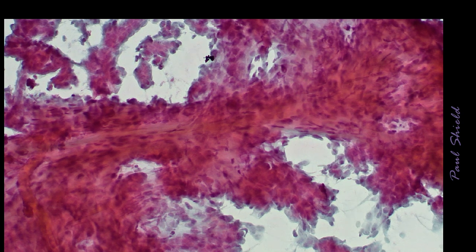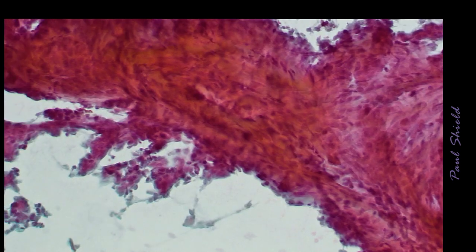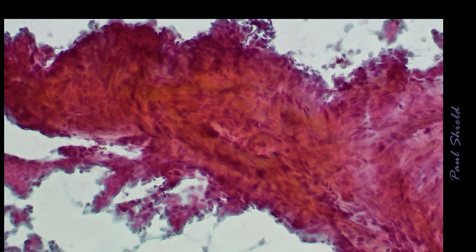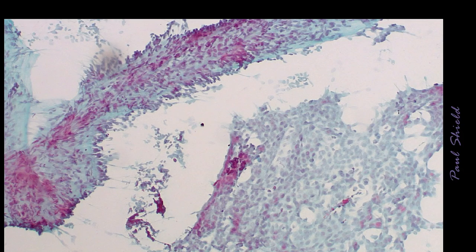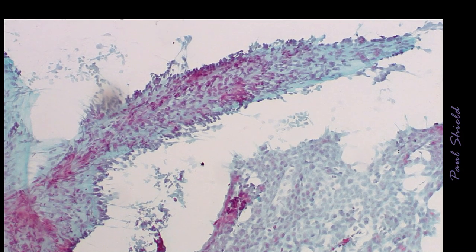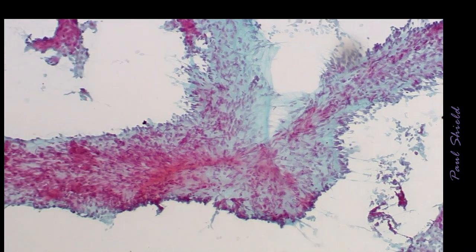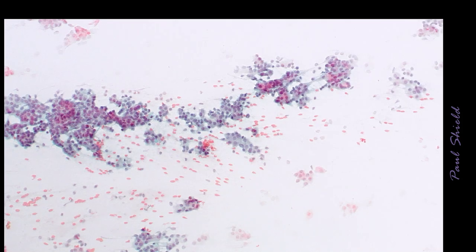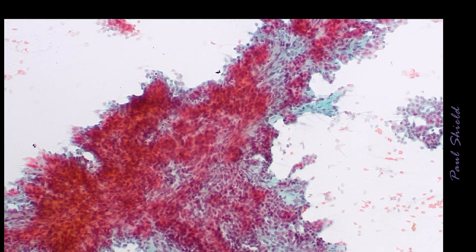And then in the background we have epithelial cells, and you'll often see them palisading in like a crowded palisade around the outside of the group. Often you can make out a bimodal pattern in those, but not always. Sometimes you'll get like this, which are like stripped cores, this collagenous vascular material that the epithelium has been stripped off, and you can see it lying in the background.